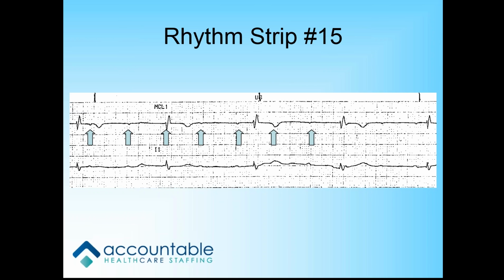Exactly. There's your P waves. Ah, got it. So, is there a QRS for every P? But I don't have a QRS for every P. No, you don't. See, there's all your QRSs.